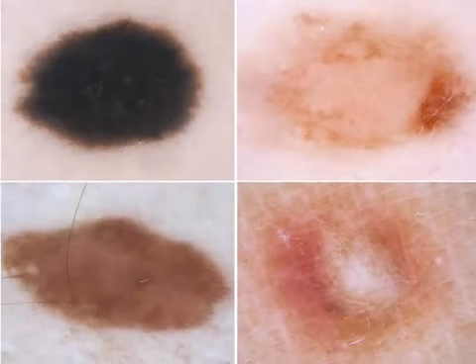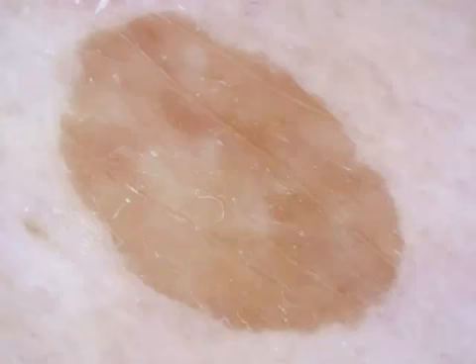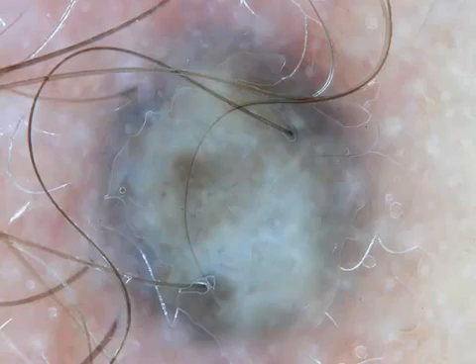But this podcast will not deal with lesions that have structureless pattern in combination with other patterns. This podcast will deal only with lesions that have only one pattern, which is structureless. For example, here, this is a lesion with only one pattern, structureless, and the color is brown. You see that structureless doesn't mean completely without structure. It only means that there is no identifiable basic element. Here we see a lesion that is completely structureless, but it's blue. You know immediately it's a blue nevus because this pattern is so characteristic.